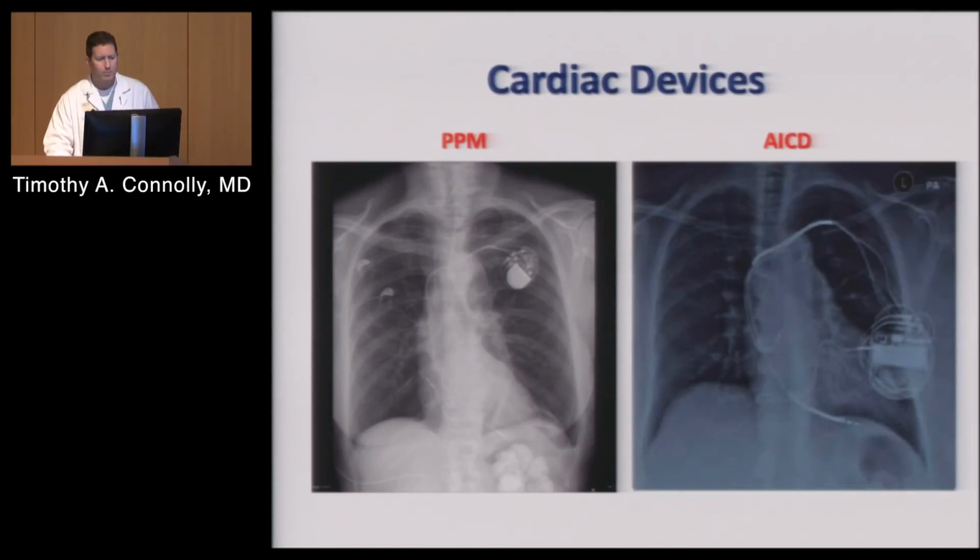Now, this is something I always point out to our fellows because few of them ever know how to make the distinction between a pacemaker and a defibrillator. And I can tell you in the office, patients never remember which one they have. And when they give me the little card that they got from Boston Scientific or whoever, it's saying a bunch of things that don't mean anything to me. So I look at the plain X-ray. A pacemaker is going to have these normal thin-looking leads, whereas a defibrillator, this right here and that right there are the paddles. That's all you need to know in terms of distinguishing between those two.